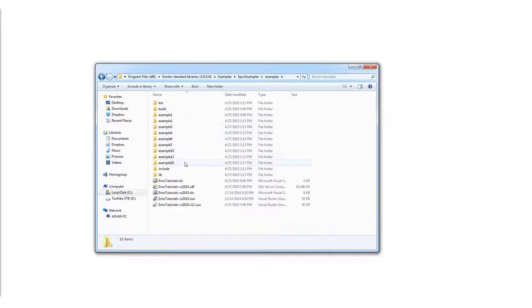All of the C++ examples on Windows are Visual Studio projects. You can get a free version of Visual Studio Express online from Microsoft's website.